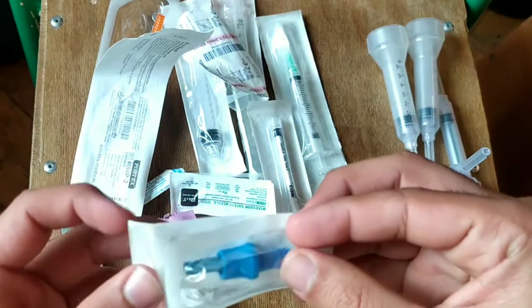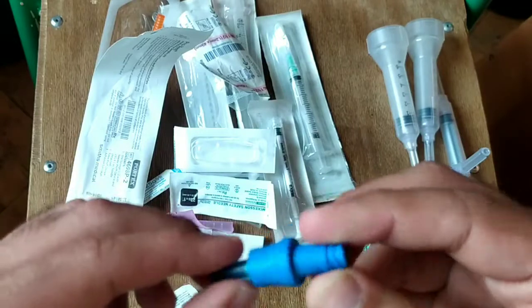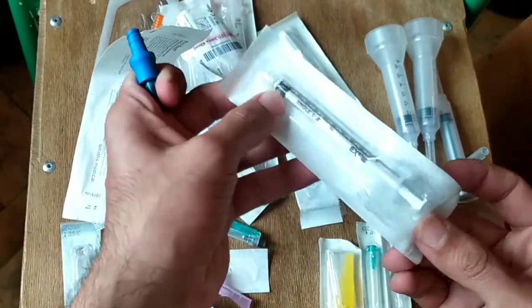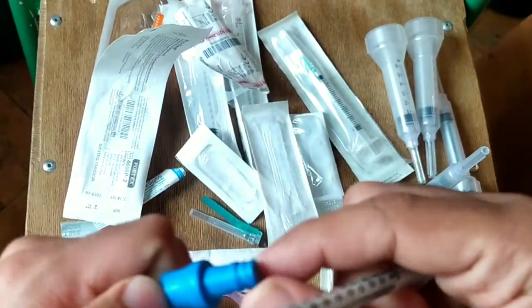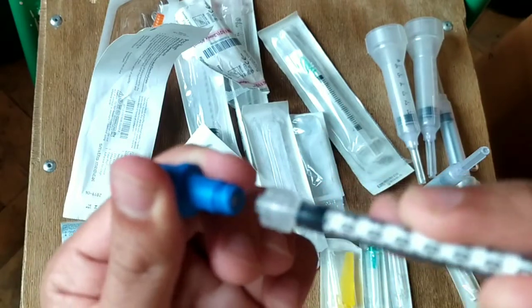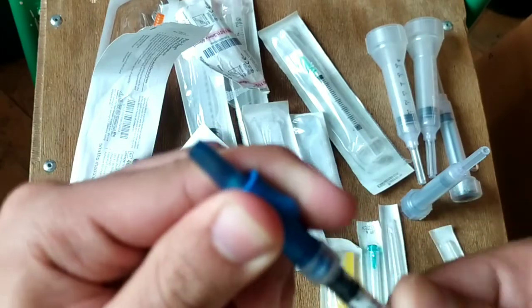After needles and syringes, we also have a small apparatus which is called the connector. When there is a requirement for a longer syringe and we do not have one, then these connectors can be useful. These connectors have a one-side valve, and we simply connect it to the luer lock like this.